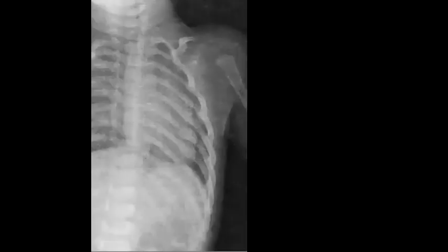So in this patient, I think you are going to check if this patient did skeletal survey. Yeah, non-accidental injury or what is called child abuse. So there is multiple rib fractures. So you can see that there is multiple rib fractures in the posterior aspect.